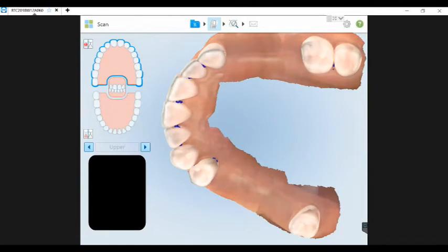As a dental professional, I'm accustomed to looking at gingival tissue and teeth. However, that being said, it's critically important to look at your scan and evaluate the scan in the stone model or monochromatic, because truly that's going to be the way that the laboratory is going to be looking at it. Does that make sense?